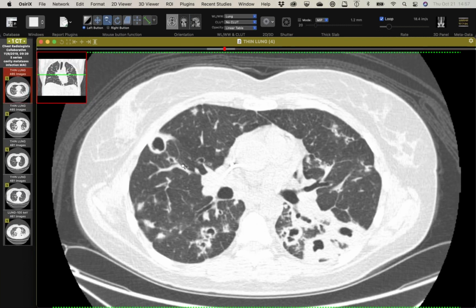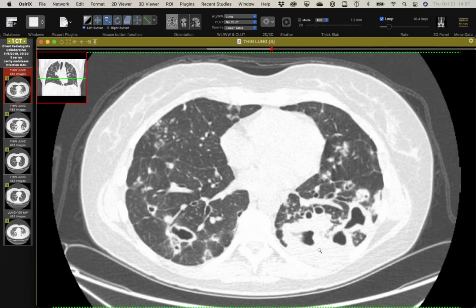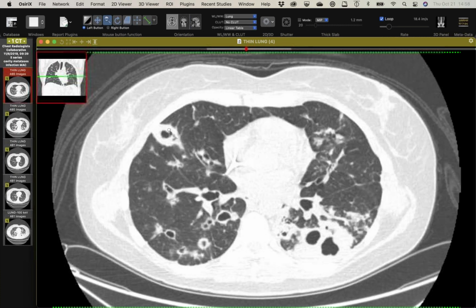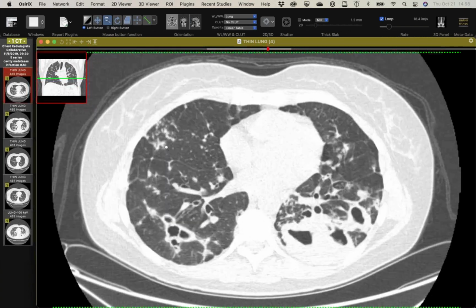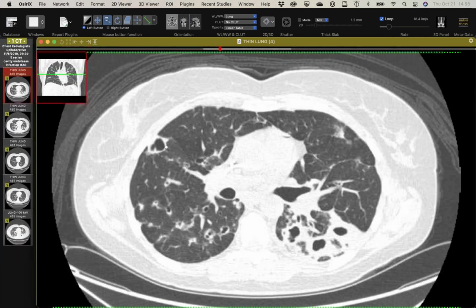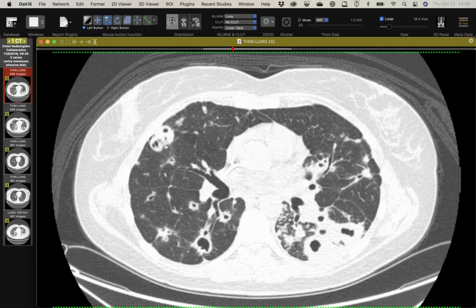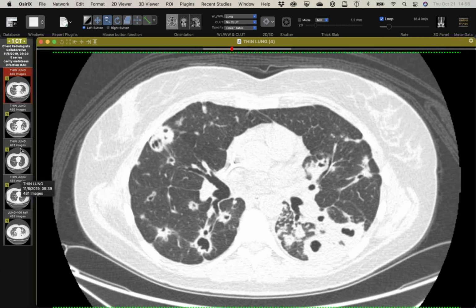And in this left lower lobe, all of a sudden they got really thick, and this cavity got really complex, and there's a lot of debris in it. Some of the walls are starting to get thicker and have a little bit of fluid level. She was admitted to the hospital over the summer, kind of ill, and they ended up bronching her, and they recovered Mycobacterium avium complex. So a superinfection with MAC in cavitary lung disease from metastatic colon cancer.